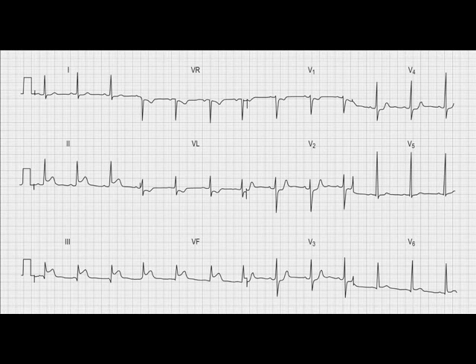Here's the next example, and let's look at this systematically together. Is it a clean trace? Certainly is. Nice sharp lines. Do they progress horizontally across the page? Yes, they do. A little bit wavy in the lines, but generally they progress horizontally. You must see 25 millimeters per second printed on the 12 lead. You don't here, it's a textbook example, but you must in clinical practice. And the box calibration on the far left for the height of the complexes does equate to 2 large squares high.